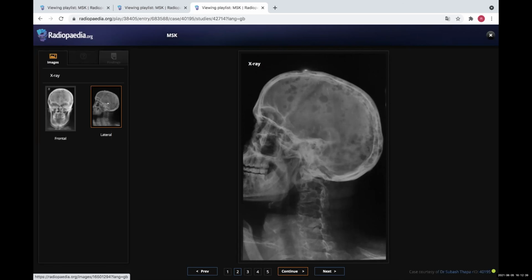And as you said, the lesions in multiple myeloma will be more discrete and small, uniform in size, as we see here in the skull. However, in metastasis, it will be a little bit different and heterogeneous in sizes, and it is not so well defined, and the endosteal lesions are not so well seen as in multiple myeloma.